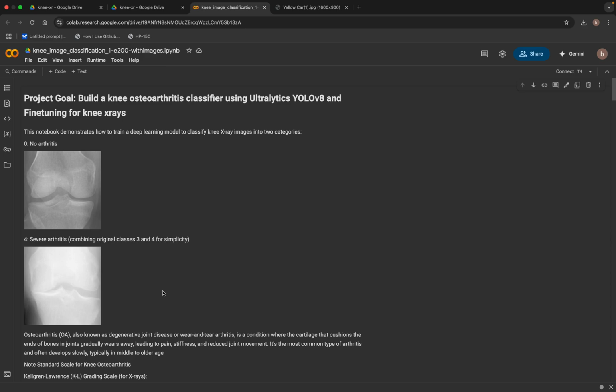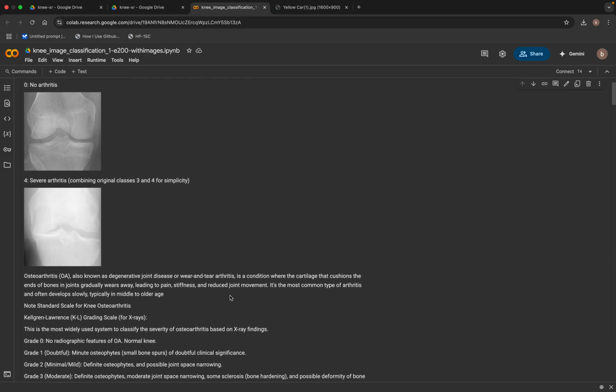Once you've gone through this Colab, which I have a link to below in my GitHub, you'll be able to use this same Colab for any images you want. You can look at brain images, or chest X-rays, or ultrasound, or whatever, and just learn how this works. And it should be fun.